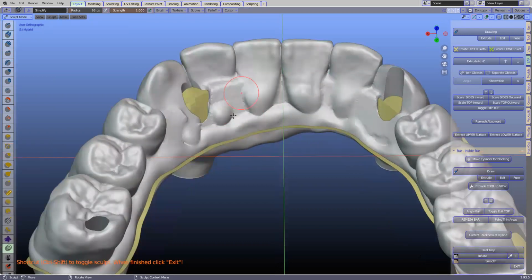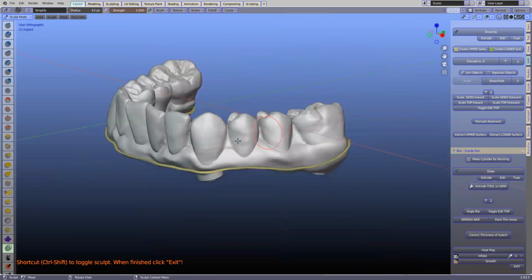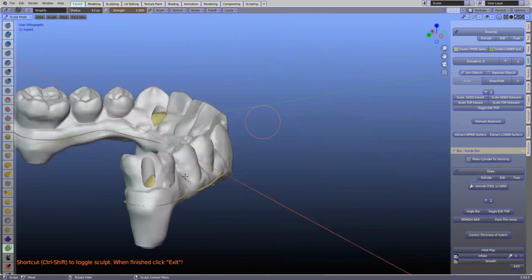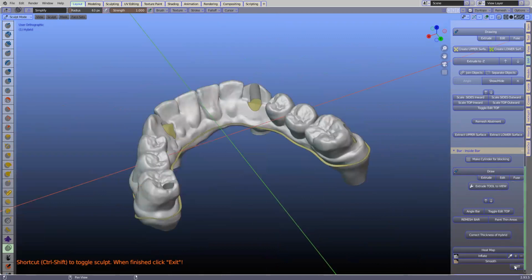I think we have it. If you don't think it is protected at this stage, because we need it protected when we are cutting. Once it's cut, once the two have separated themselves, yes, that's when we then have it protected. Okay, then you could essentially smooth it as well. You can, and I'll demonstrate how that works. So let's exit.